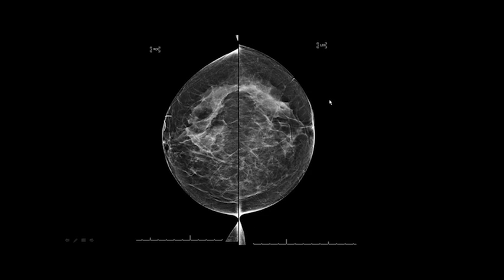So why did the radiologist feel it was inadequate? And they called the patient back to make sure the patient had a very good mammogram. Well, they had comparisons, obviously, because here's some retroglandular fat, but there wasn't very much. They didn't like it. They felt they were missing posterior tissue compared to other years. So they called the patient back for a technical repeat.